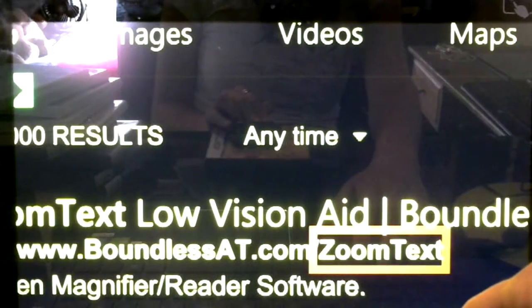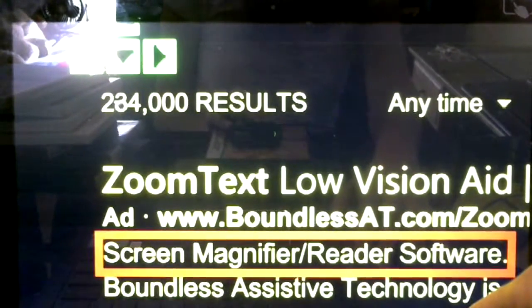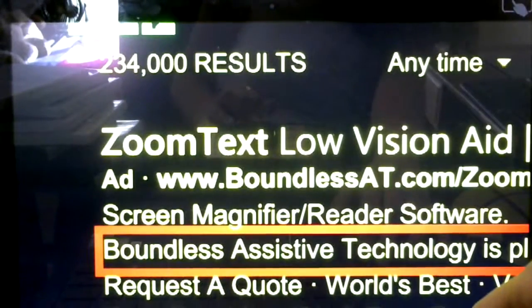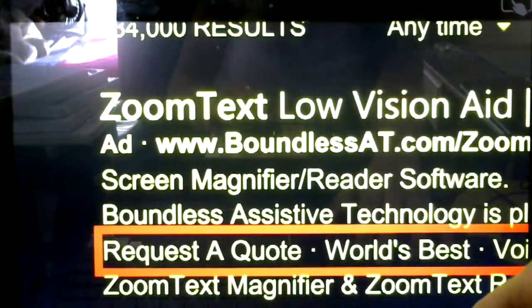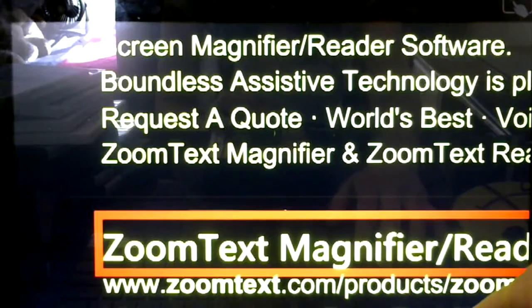This program is all about finding things, seeing where you're at, knowing where you're at, not getting lost. A lot of this is highlighting, making a border around where you're focused at, changing the colors maybe. Just again, it's for customization of where you are at on the screen. And of course, it is quite useful for not getting lost and seeing where the program is reading, especially for those of you who are using a screen reader and you need to know where you're at.